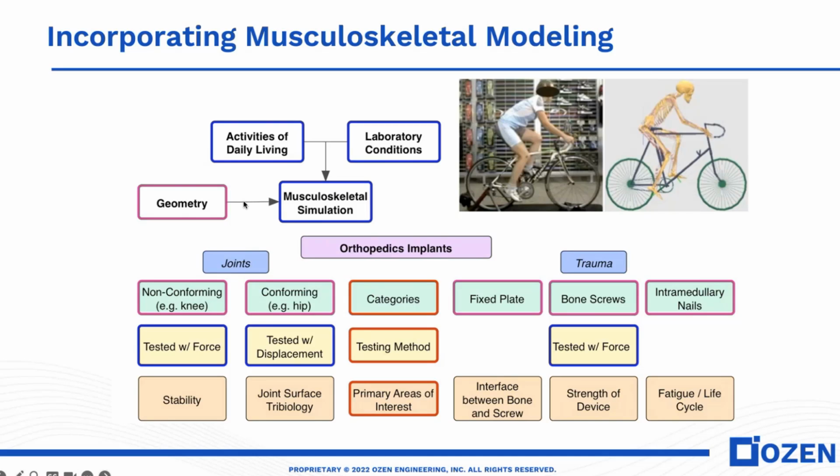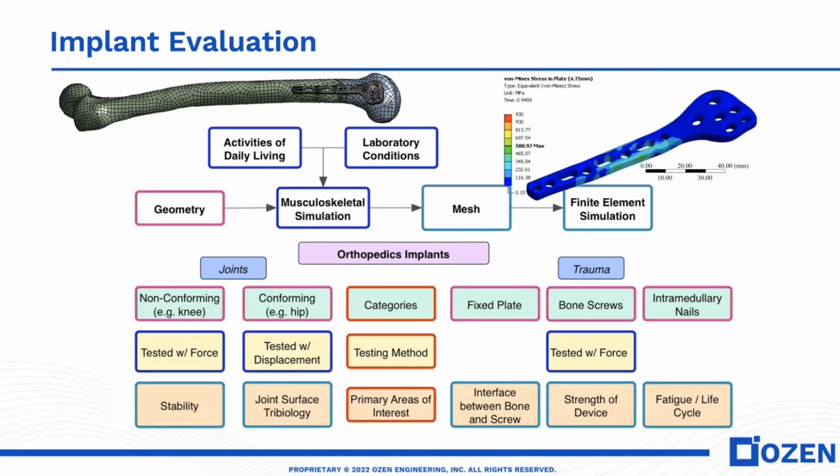So we can bring the geometry into musculoskeletal simulation, feed in activities of daily living and any lab conditions, and we can address the testing of the implant by using these musculoskeletal models.